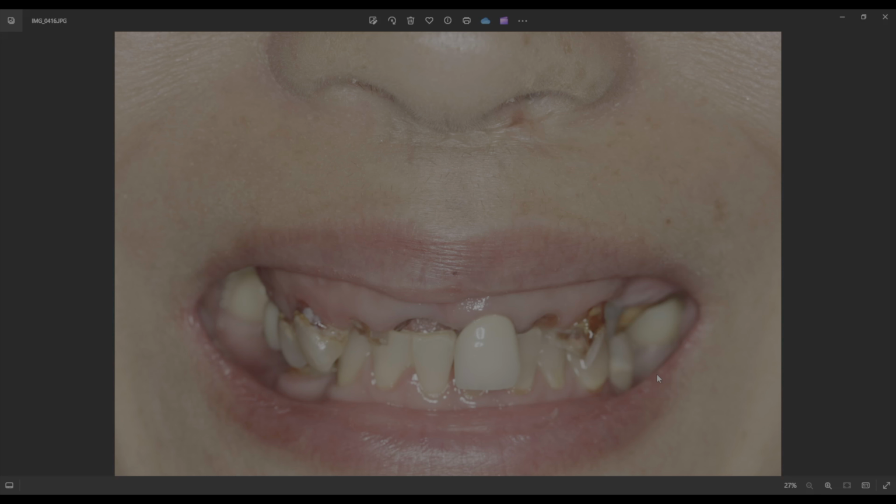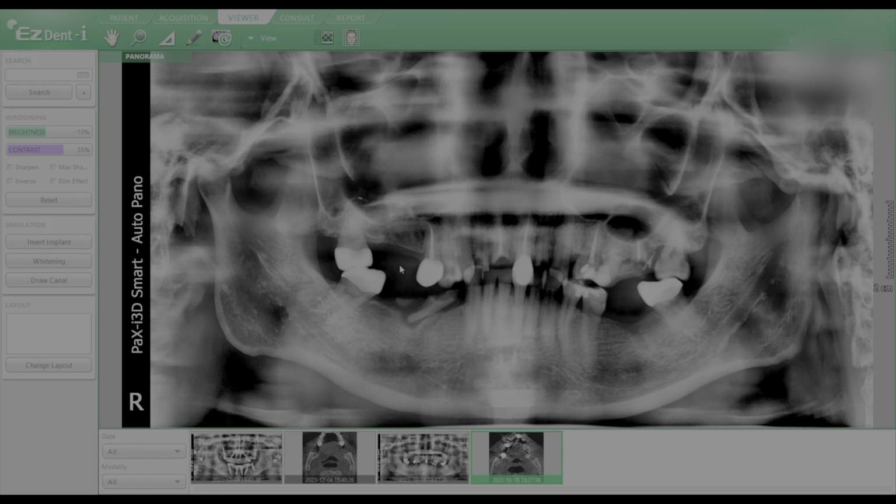All right, so basically, this is a patient that came in about 2 months ago. She has obviously a lot of broken down teeth. She's missing a lot of teeth, and she's got a collapsed bite. But let's look at her case, her X-rays. Okay, so obviously we see the missing teeth, the broken down teeth. She's got some root canals that are getting infected also. We see a similar situation. Now, we were just talking about this, obviously, large sinuses. She definitely has some large sinuses.